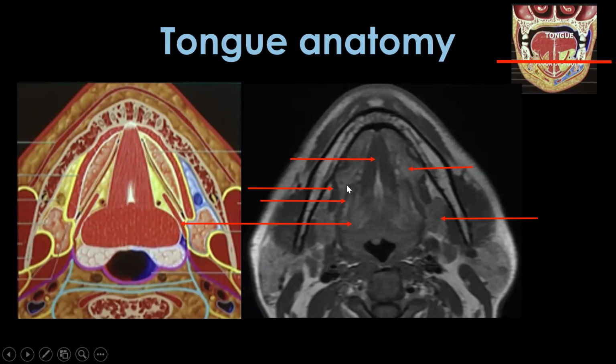These are the hyoglossus, paired hyoglossus muscles, important because we can trace the lingual vascular bundle along these. This is the mylohyoid. We can see here the mylohyoid sling. Same way, this is the mylohyoid sling. And lastly, the sublingual and the submandibular gland. They also have fatty tissue within them, so they will also have slight hyperintense signal. That is why muscles are hypo, but they have hyperintense signal. And so this is a sublingual region and this is a submandibular region.